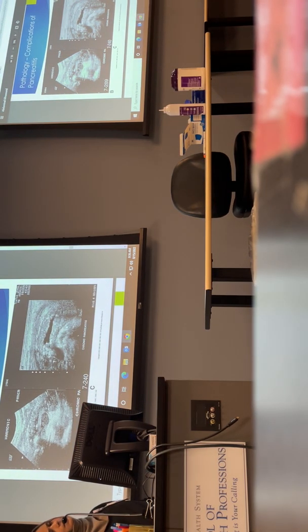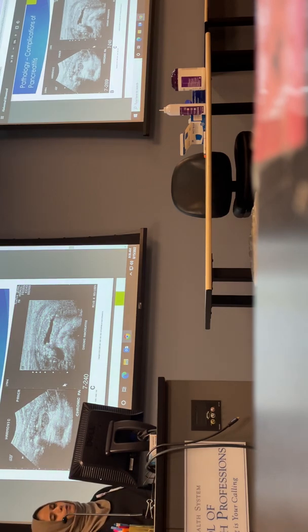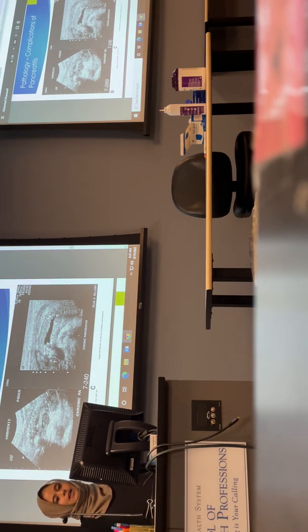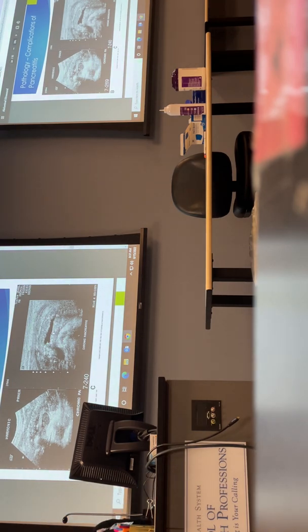Here, if I were to give you this image and ask you what's going on here, remember that this is a ductal dilation because clearly we have pancreatic tissue above and we have pancreatic tissue below. Yes? So that is clearly an example of ductal dilation. And this duct is dilated because of this mass that is present towards the head of it. Normally we don't see ducts that are this dilated. The dilation causes it to look very similar to a vascular structure. So again, you should have pancreatic tissue on either side.